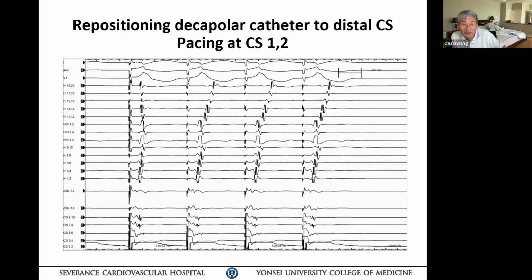For example, in the left anterolateral wall, the appendage muscle is thicker in the annular area. When the pathway inserts there, it is very difficult to ablate and difficult to see the pathway potential. It will tend to be quite broad. Similarly, when they insert in the ligament of Marshall. On the other hand, if it is just a simple left lateral pathway, it's going to be right underneath the coronary sinus. But the reason you don't see the potential many times in the coronary sinus is that it is surrounded by coronary sinus fat tissue and fibrous tissue to the annulus. So that's the reason I don't see it.